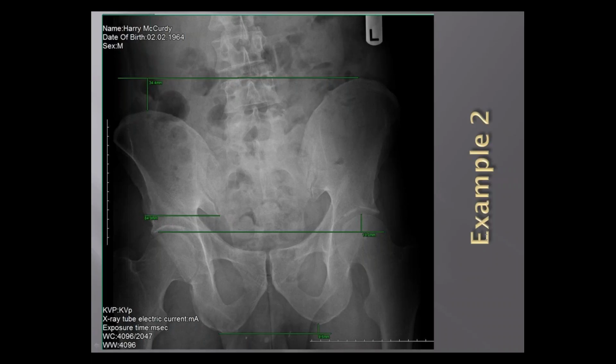Well, we see at the top of the ilium it says 34. I rounded it off to 34. Sure, I'll take 34. And on the left side, I rounded it off to 9. Okay. And subtracted the difference between the two because, being on the same side, they're both on the same side of the ilium, so you subtract it. Yep, good. And you got 25. Yes.